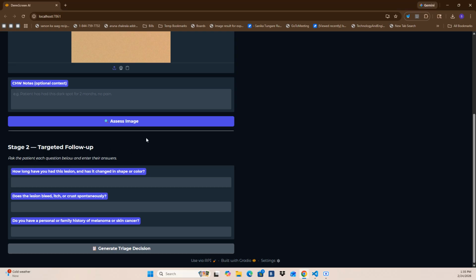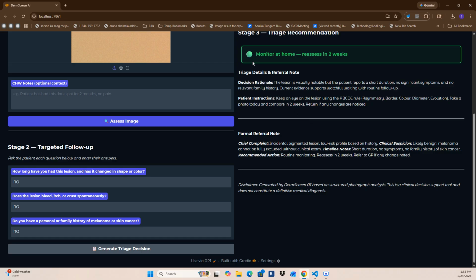So for example, I just said no to every question. No, I don't have any itchiness, I don't have any bleeding, no, I don't have any lesion, that kind of thing, and no family history. Then it will just give you a monitor at home or reassess in 2 weeks, just general information.